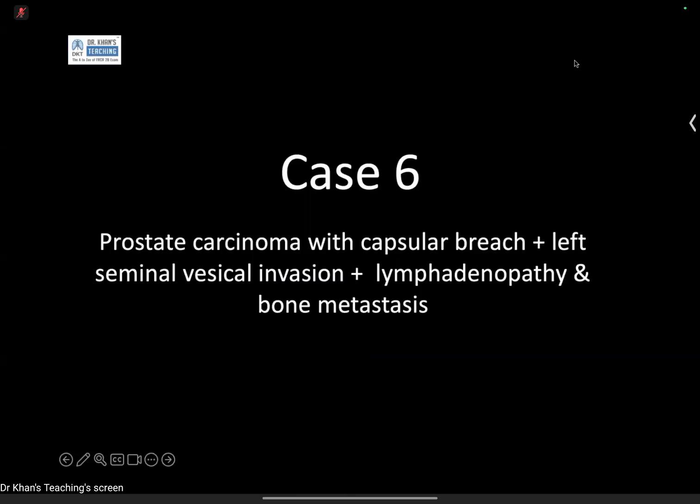Now, this is a case of prostatic carcinoma with capsular breach, left seminal vesicle invasion, lymphadenopathy, bone metastasis. And I'm going to go into a rapid fire, teaching type of mode. It is not a session just for prostate MR, which we can do in future, but I will rapidly go through a bit of teaching of prostatic carcinoma MRI. Please remember, prostate carcinoma MR, you should know it for your exam, just like rectal carcinoma.